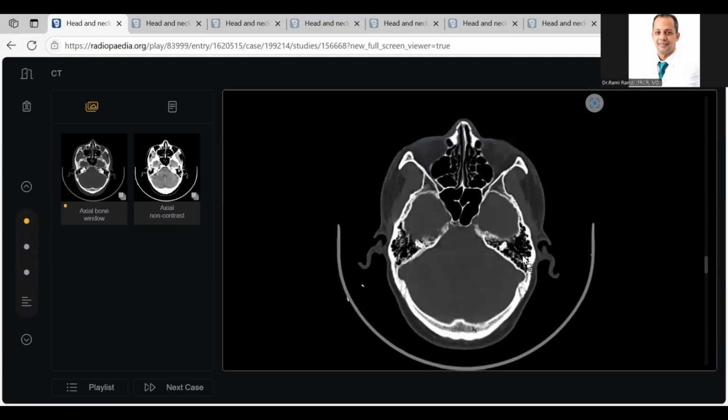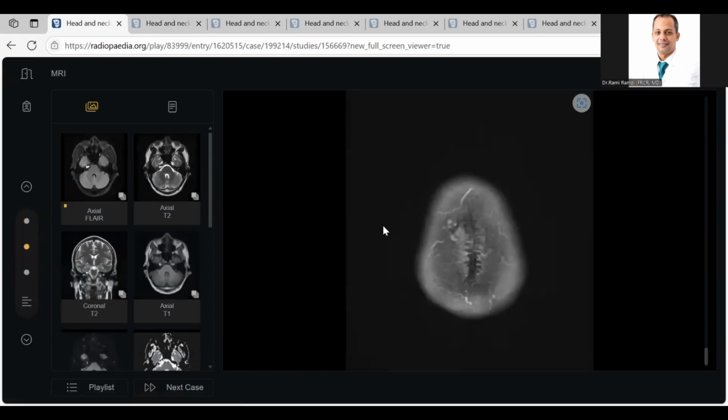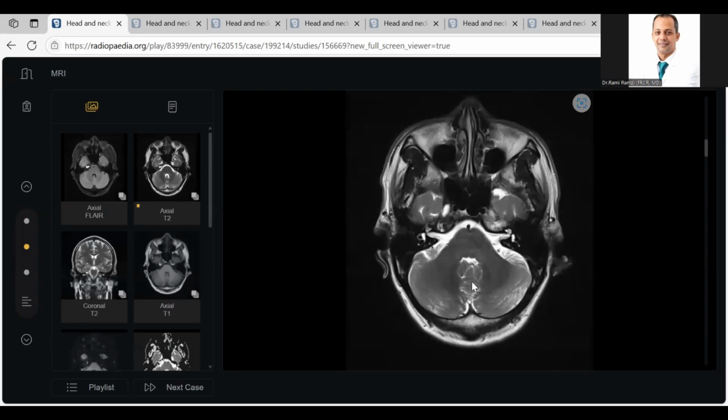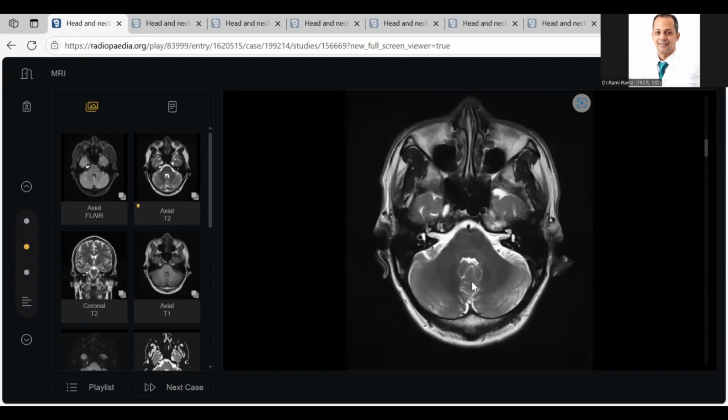Second, compare. Especially in skull base, there is a golden rule: compare right by left. Especially in skull base, the lesion will not be picked up without comparison. Second point, this lesion is not extending to the Meckel's cave. If it extended to Meckel's cave, it would be another possibility, another pathology. It may be trigeminal pathology. It is located in the apex, confined.